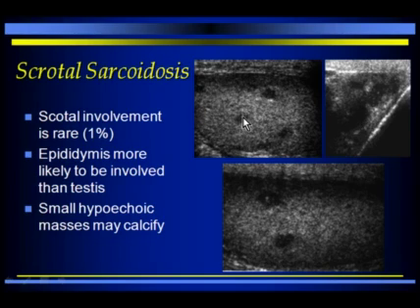The hypoechoic foci are classic for scrotal sarcoidosis. They're not specific for it, but in the right setting, you can make that diagnosis, and these small hypoechoic masses can calcify.